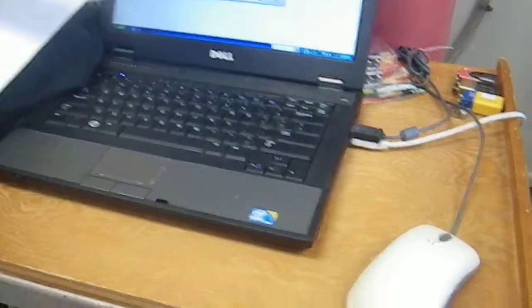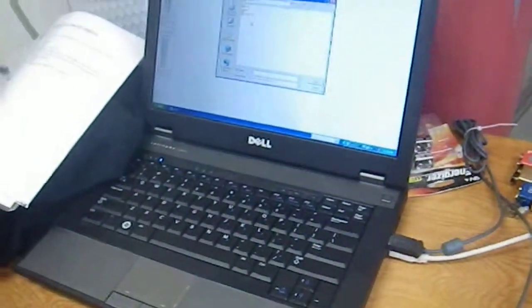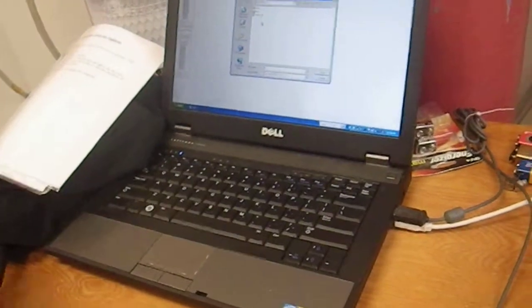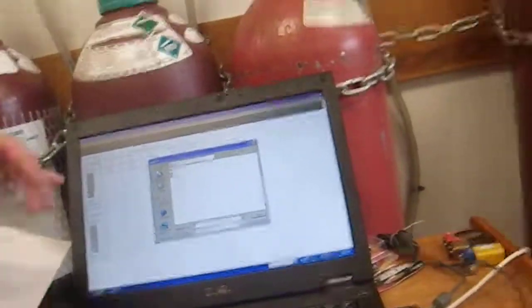Otherwise you have to close the program, open it, and open your data monitoring table or whatever. All those extra steps take up a lot of time if you're doing a lot of files. If it's only like 2, sometimes I just repeat that process, but you have to open and close the program. That's fine. It'll be the same.